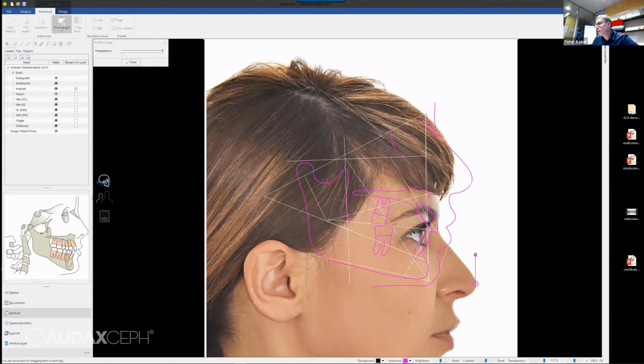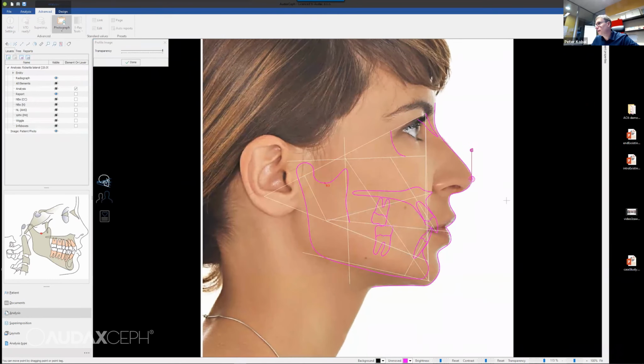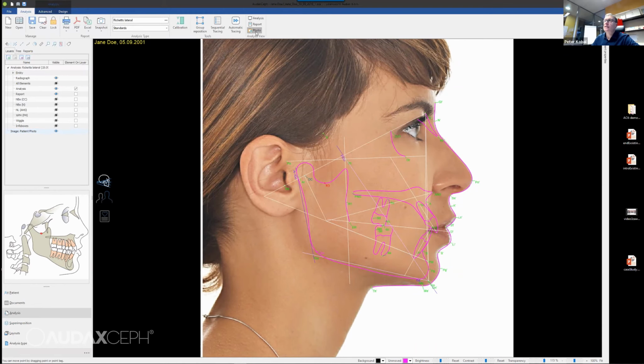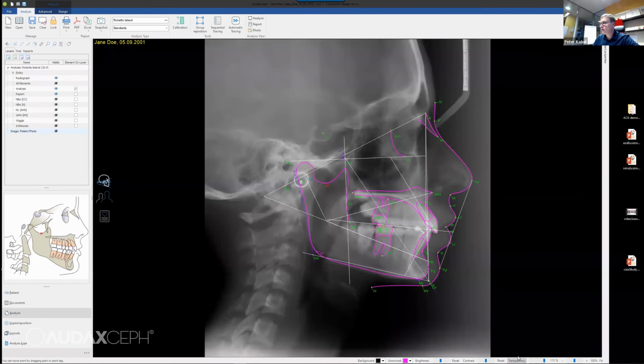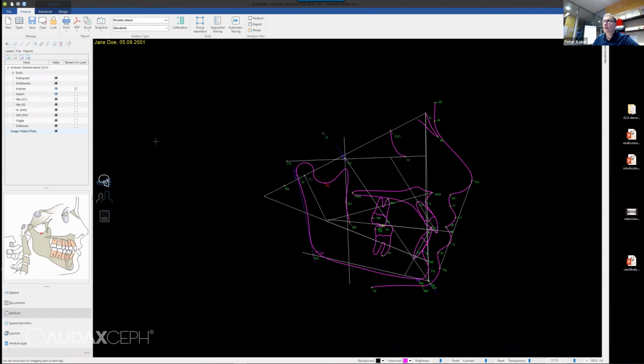Now I'm working in analysis, not in VTO. So this image was placed into it, and a new layer is shown here, and I can switch this image on and off. Also, in the analysis, I can switch on and off what I see here. If the image is switched off, we can also set the transparency here, or have something like this on our screen. So we can play with different view sets directly from here.